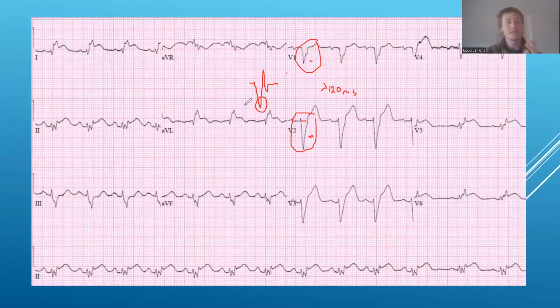And left bundle presents a really interesting problem when we're thinking about trying to diagnose STEMI, because as you will have noticed if you've looked at a lot of left bundle branch blocks previously, they have these really atypical or unusual morphologies compared to our normal ECGs, where we have these discordant QRS complex and T-wave sections. What I mean by discordant is that the QRS complex points in one direction and the T-wave points in another direction.